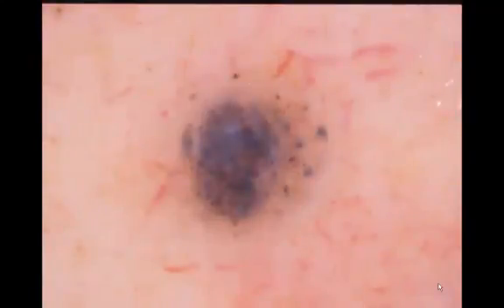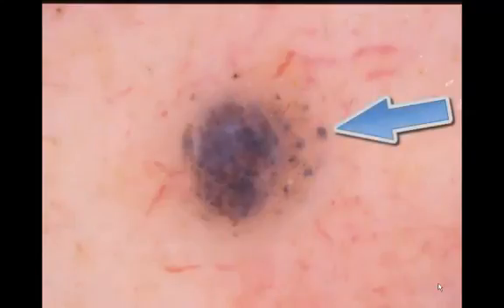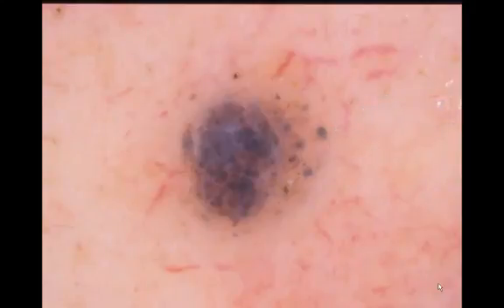This is a basal cell carcinoma and it consists of blue globules. Why call these blue globules now blue ovoid nests? Only because they are blue, or only because it's a BCC? It would be much easier to use the same term for the same structure all the time.